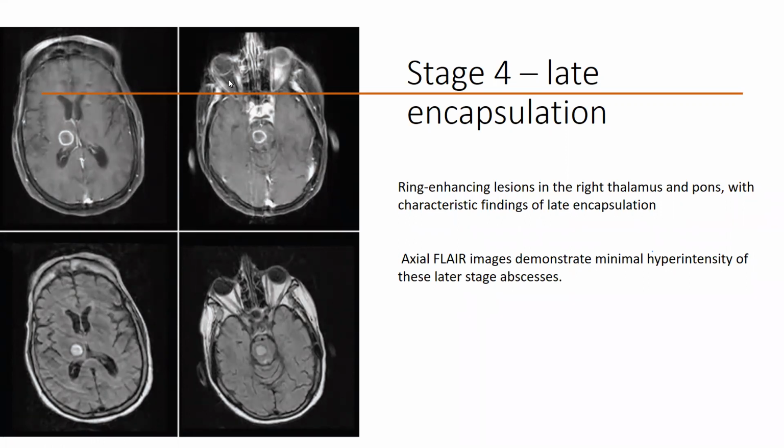Yeah, and depending on the other X-ray, CT scan chest, ESR, and all also. And the location also: you have basal meningitis, so infratentorial, posterior fossa involvement in a patient with tuberculoma. Cerebral abscess more commonly involves the supratentorial region. The cortex is usually affected.